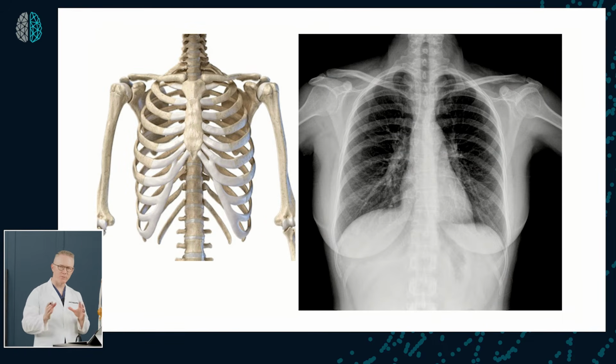I wanted to reinforce this here on this image so you can again see, just like we saw before, that the scapula, when the arms are down like this, are in the field of view, okay? That's important to recognize. But if the arms were to stretch, you can pull those scapula out and around and get them out of the view, and again, in more of a PA view, okay?